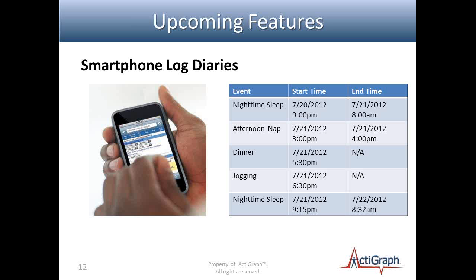so the doctor can obtain it real quick, where they can respond back saying, okay, all right, you went to bed kind of late or you woke up kind of early or too late. It provides insight on what the user is doing. And this also integrates with data stored in the remote monitoring system. So we tied the two together to make the best of the data.